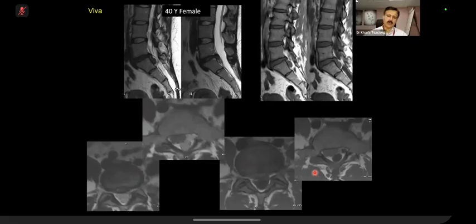Okay. So if you see here, you can read it. I don't have time, but in our ST2 teaching, I will teach this in detail. The nomenclature of disc herniations: what is a protrusion, and what is a broad-based disc protrusion versus a focal or a narrow disc protrusion, and then what is an extrusion, and then extrusions can be with sequestration, as in this case.